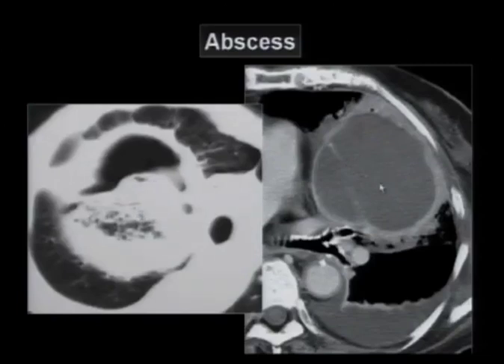This is also another lung abscess here, and this is a patient who didn't classically present with shaking chills and whatnot. This is a patient who did have features that would suggest clinically that they were aspirators, and often these patients may present with low-grade shortness of breath or a cough and not too much of a fever with a sort of prolonged history that smells more like a neoplasm. So you have to think about that when you see a large lesion like this showing areas of low attenuation, suggesting necrosis.